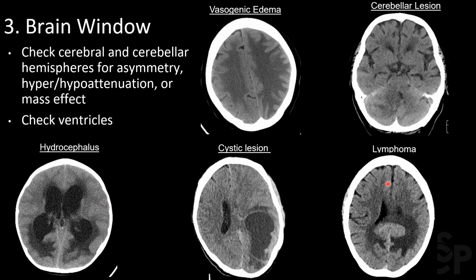If we move on to our last two examples, in this one, we can see along the left posterior hemisphere that there is some kind of cystic structure here with a central hypoattenuating region surrounded by a thin hyperattenuating membrane and some edema along the periphery. This can be either an abscess or potentially GBM, and MRI can be better used to evaluate.